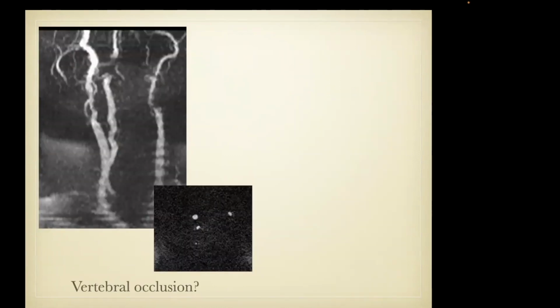As a good example of this, here's a patient where you can see, again, this is that stacked coin appearance, 2D time of flight imaging in the neck that goes into the chest here, and you'll see some flow-related enhancement in the carotid.